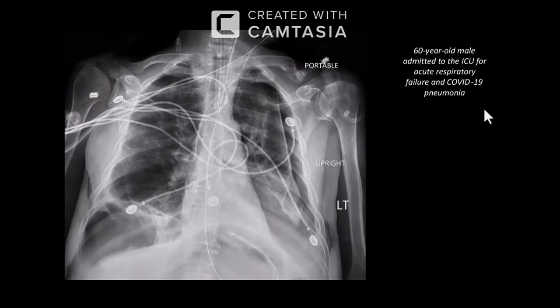I am also now looking for the other findings. I can see that there is an area of lucency noted just beneath the right hemidiaphragm. However, I can see that there are some haustral markings, so I'm suspecting this is most likely in keeping with Chilaiditi syndrome. There is also blunting of the right costophrenic angle noted as well. So putting it all together, I'm also having a look at the bones.